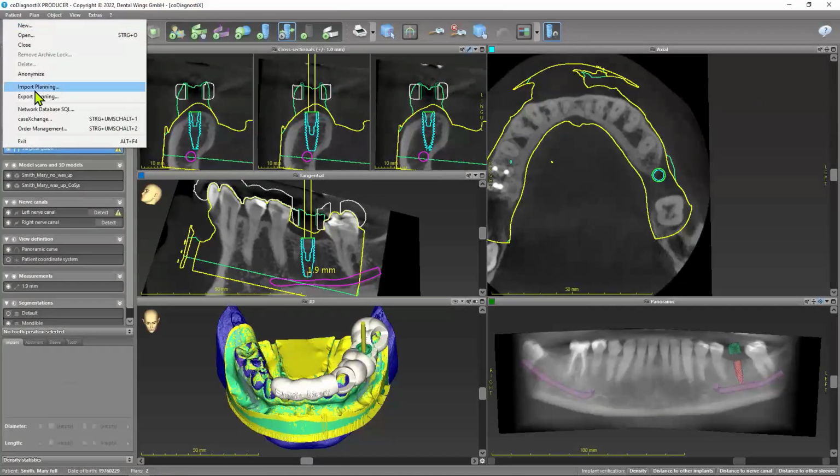In the beginning, I explained in the management window to make an archive of the complete data set. This means archiving stores everything, even different data sets from the patient. Here we have import export only of a single plan. This is the smallest data possibility, maybe for transfer on a USB stick.